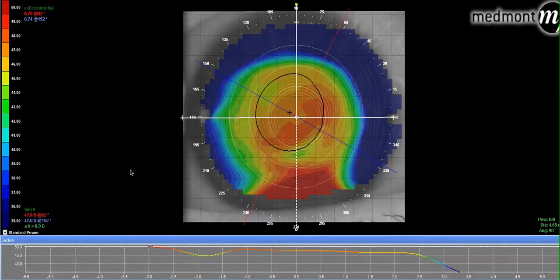This is an orthokeratology case where the patient is getting some distortion in vision after wearing lenses, and it looks like the treatment zone is pretty small. This is a baseline topography, and what I'm noticing is there's a little bit of asymmetry to the cornea, especially if you look at the profile. You can see that it's not very symmetrical, especially when we look in the vertical meridian.